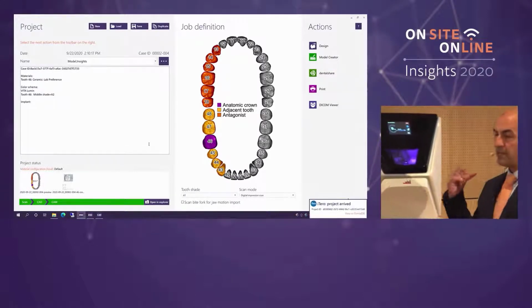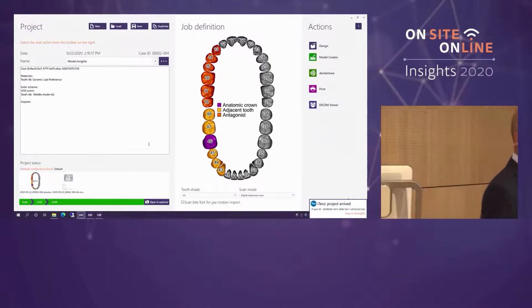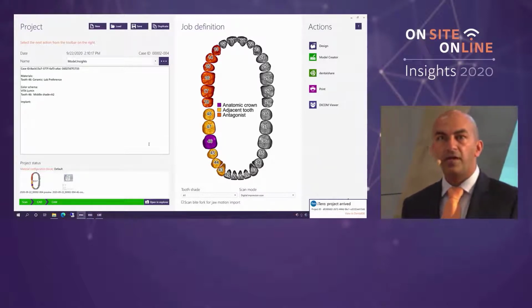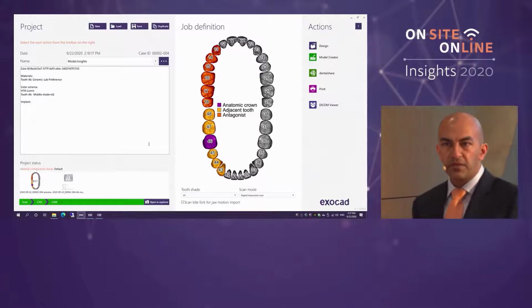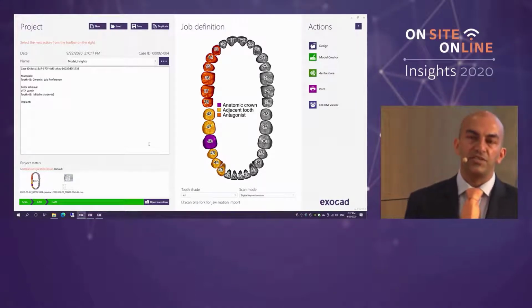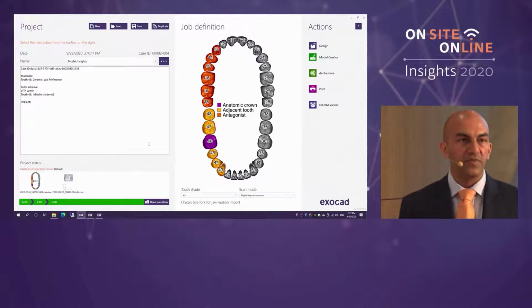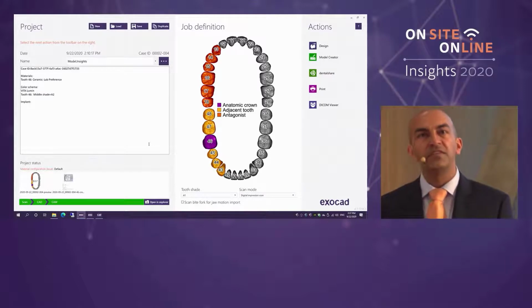I should tell you that the way it works with the VHF milling, as well as some of the others, is that even if you choose it to be a fast mill rather than a high quality mill, the fit quality will always remain the same. So it will never change the quality of the fit surface. What it does is it will change the quality of the polished surface, the external surface. So in this particular case, just for speed, we've asked it to do it on a fast mill, but you could choose high quality and see all of the intricate detail.